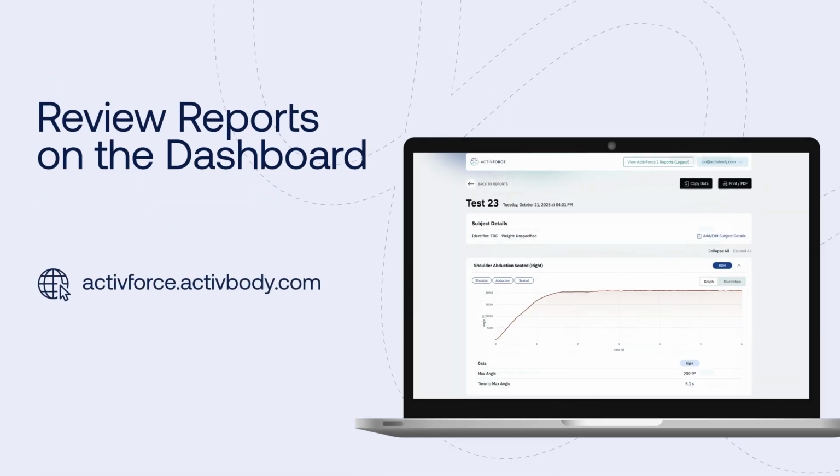View the full session report on the web dashboard. Use objective strength data to support confident evaluation and measurable outcomes.